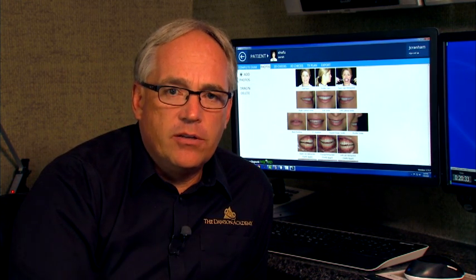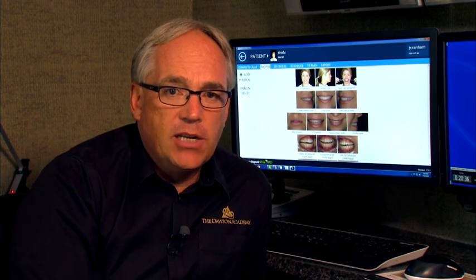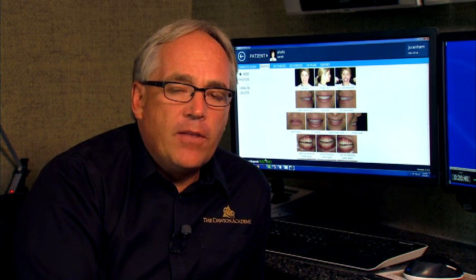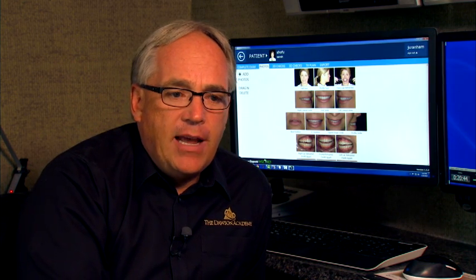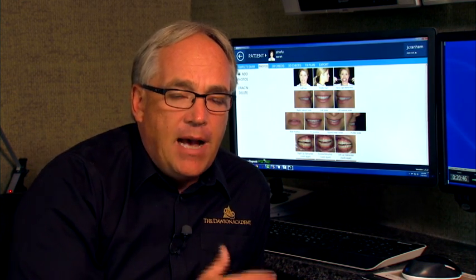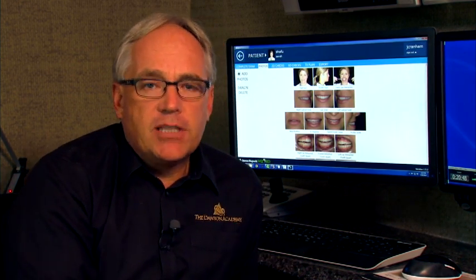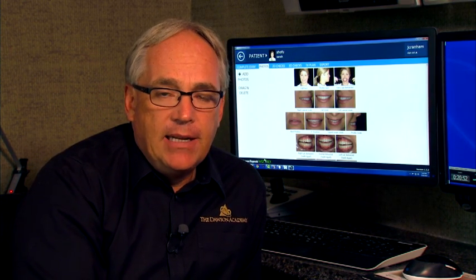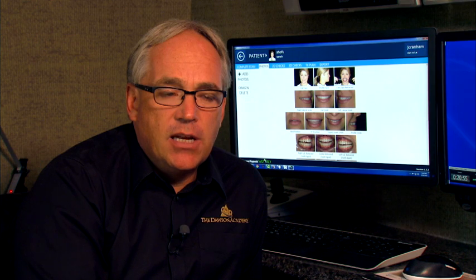Then the doctor's job is to hold the standard so that they can check the pictures. If they're not right, they can coach the assistant and give them some resources like this so that they have good skill. Beyond that, load the pictures at the time of the exam into the software so that the doctor has the time to then look at it and make the appropriate decisions.